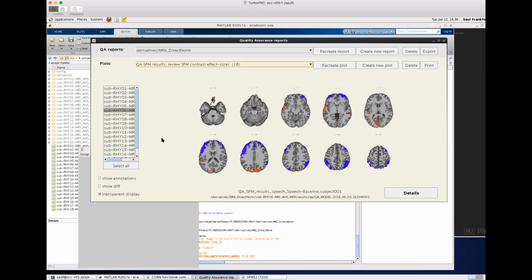So, but this cannot be seen from these plots. In these plots, they just show you the spatial profile of the activation, or supposedly activation. So in these plots, when you see something that is either ribbon-like on the exterior side of the brain, or something that is in CSF areas, activation located in those places are the typical indications that it's most likely either motion or physiological types of effects. In this case, ribbon-like is most often motion.